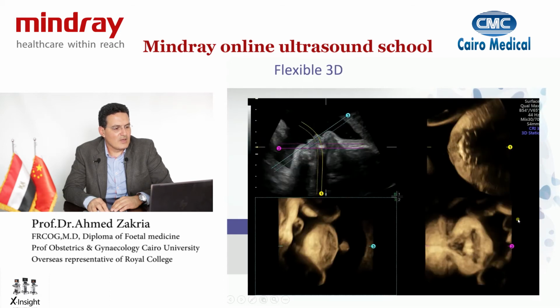So it's a matter of getting what we call, again, a flexible 3D, where you can have the volume there, and then you decide, well, I'm going to take a cut across this aspect here. So this aspect represents the lips, you can see it there.